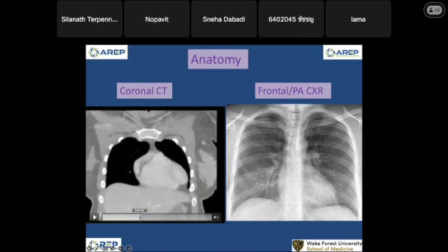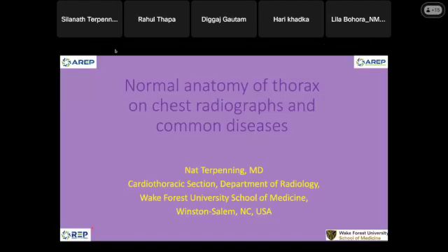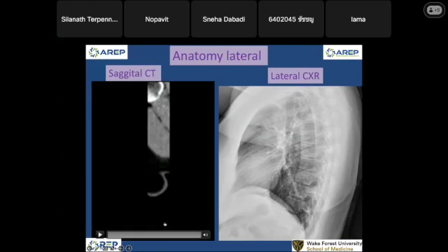Okay, that is our chest radiograph compared to the CT. CT has way more detail than chest radiograph, as you can see. That is frontal. And normally, we call it lateral projection. It's a standard chest, so we have a lateral projection as well. Okay, let's compare this structure.